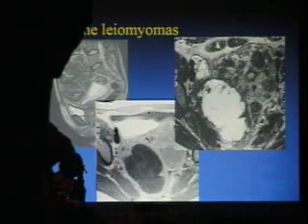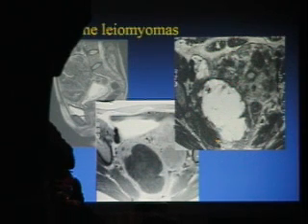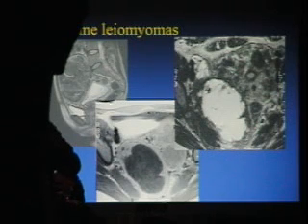gadolinium, we can see that this belongs to the uterus. It's covered in myometrial tissue, and so that becomes a cystic degenerated leiomyoma. This is not one that would respond well, therefore, to uterine artery embolization or even focused ultrasound. This is the biggest one in her pelvis, and it's clearly already outgrown its blood supply.